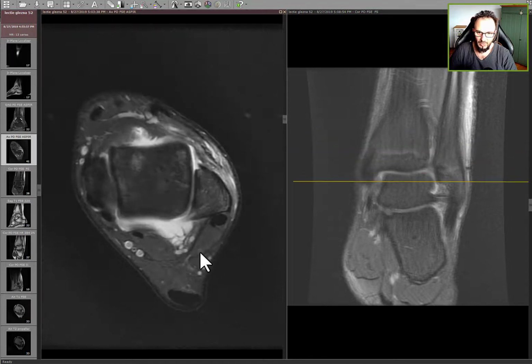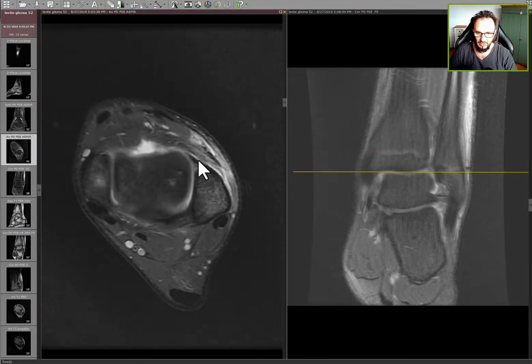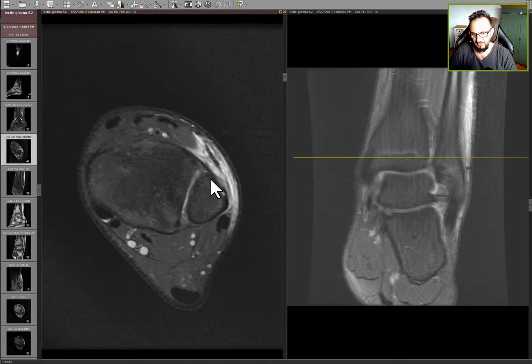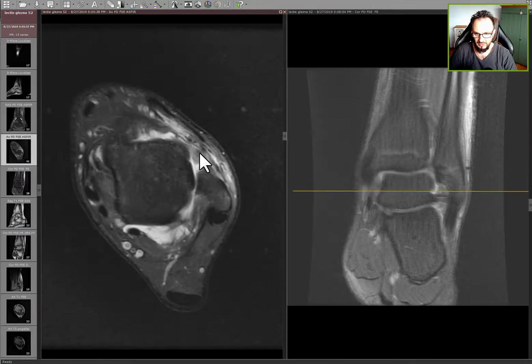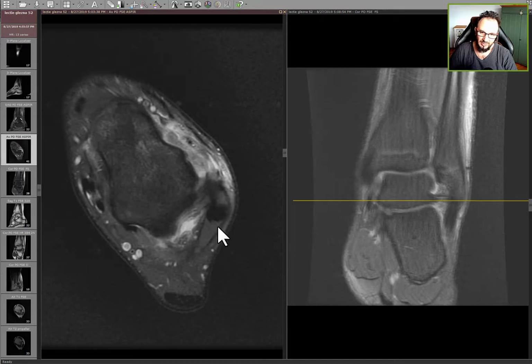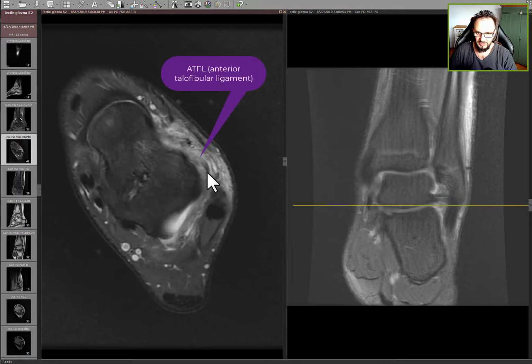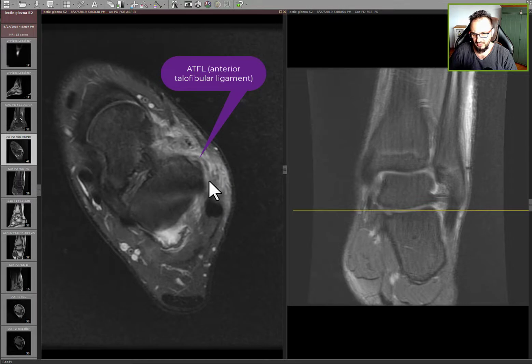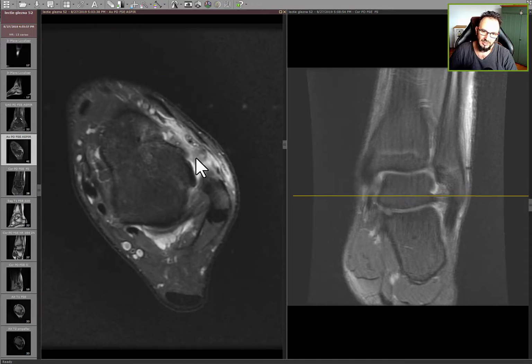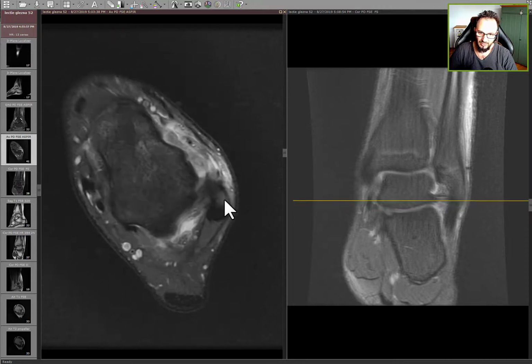And if we go lower in the distal part, we see a syndesmotic ligament, fibulo-tibial ligament here, and going further we see there is no normal anterior fibulo-talar ligament, ATFL. We see some fibers here which are torn. There is a clear discontinuity here and a lot of edema in the soft tissues around here.